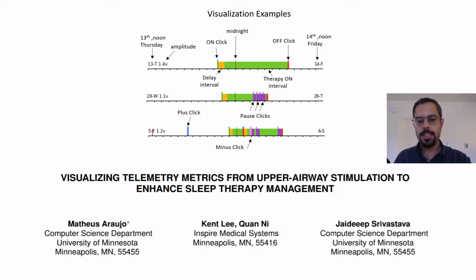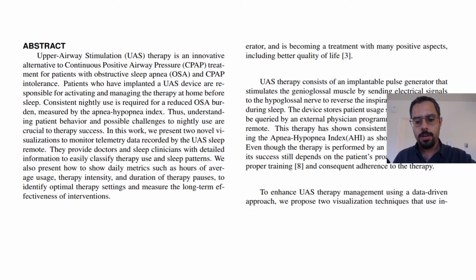I am a PhD student at the University of Minnesota, and today I'm going to show you how to visualize telemetry metrics to enhance sleep therapy management. In this project, our focus is the following. We want to provide doctors and sleep clinicians with detailed information to easily classify therapy use and sleep patterns. So we want the doctors to understand how the patients are using their devices and then take actions from it.